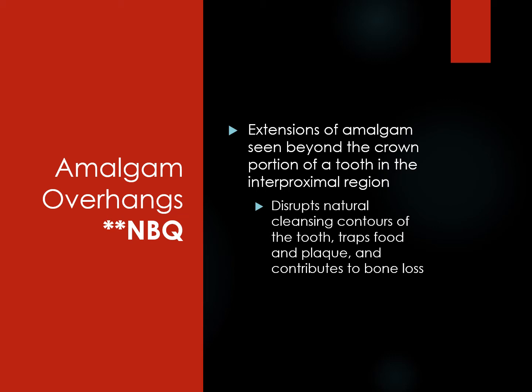So you need to let them know that if their dentist placed this filling and they didn't contour it well to the tooth, then it's doing them a disservice. It's actually harming the tissues around that filling. When a dentist does an interproximal surface tooth, they have to place this band around the tooth. And then they place a little wedge in between the teeth in order to get the band completely up against the tooth and to make the filling material that they place in there the shape that the tooth was before they drilled it away.